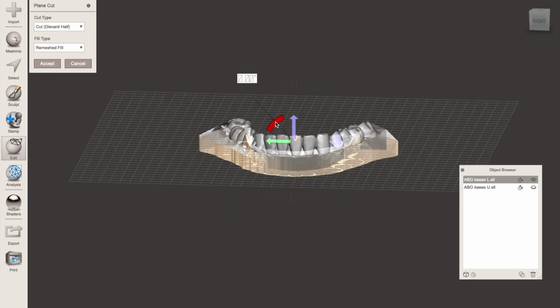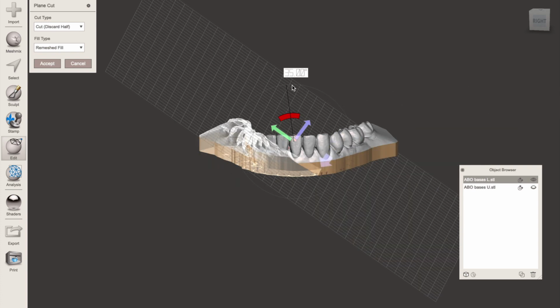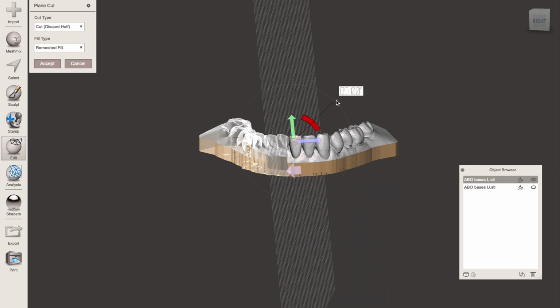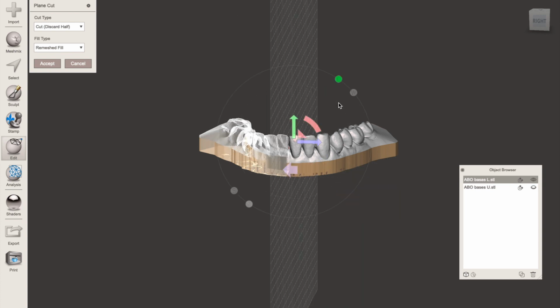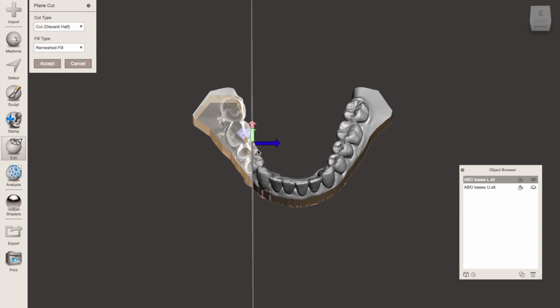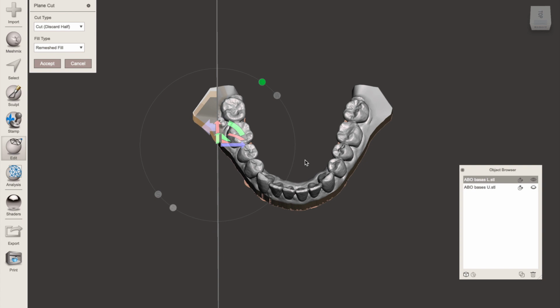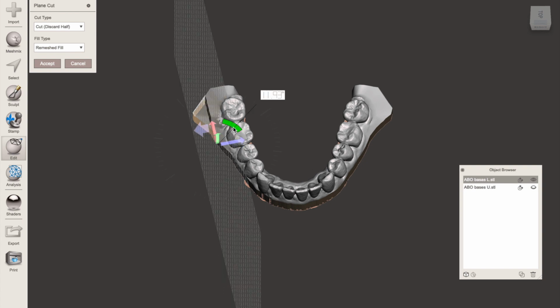It's under the Edit tab. Then you're going to rotate it to 90 degrees. Now, if you go on this little circle here, it'll click to a full degree number every 5 degrees. If you go anywhere outside of that, it'll go to a non-full degree, and it's a little bit more difficult to deal with. But I generally like to work in the grid axis here. So we can then rotate it a little bit to get the right angle.